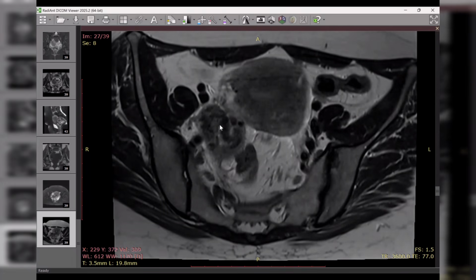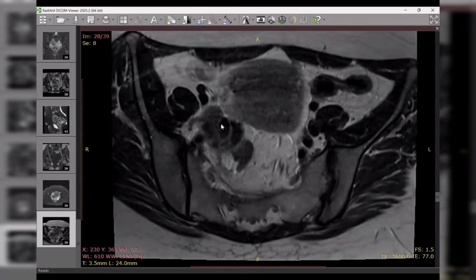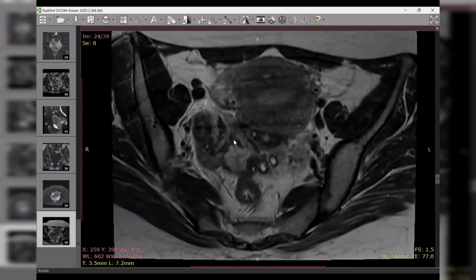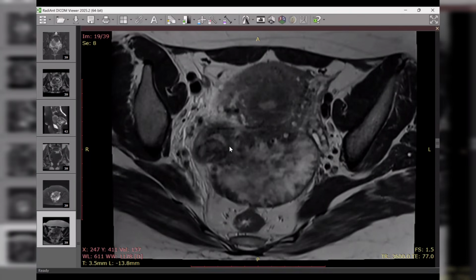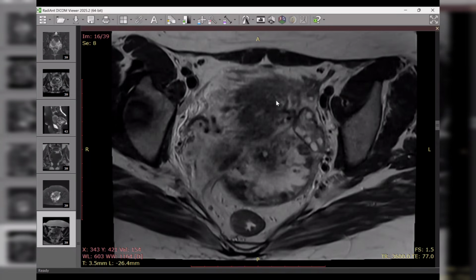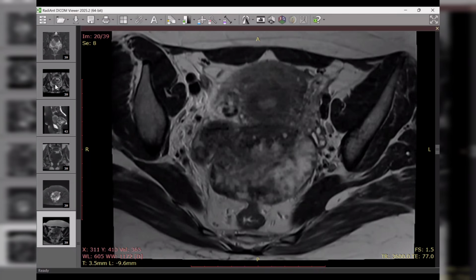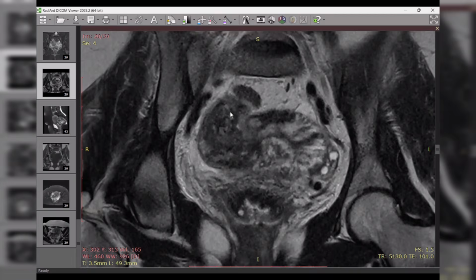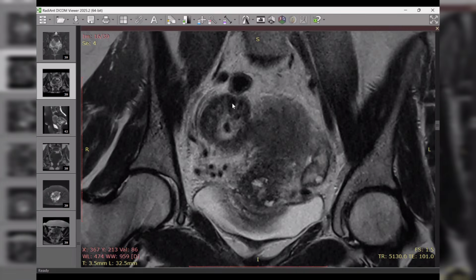So this one is the 100% sign for ovarian torsion. And the second thing is the abnormal location of the right ovary inside the mid-pelvis with enlargement and displacement of the uterus. While we are seeing here the coronal, you can see the twisted pedicle sign very smoothly here.